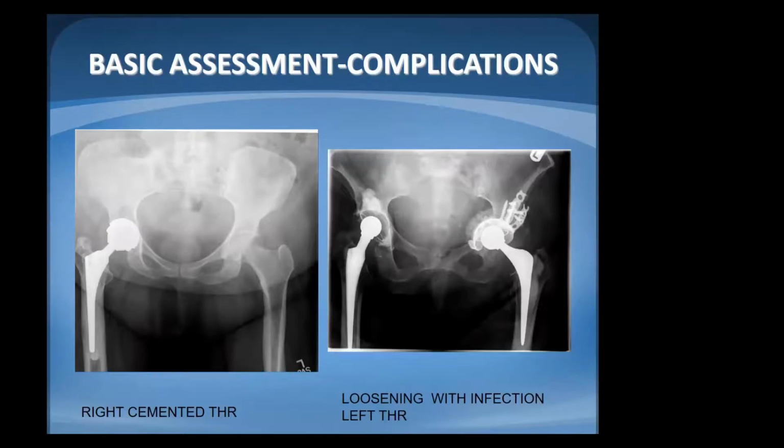That is a more threatening complication of the prosthesis, and what I would like to show you here is this kind of mushy appearance with osteolysis and loosening, extrusion of cement, protrusion of the acetabular component into the pelvis, and a clinical syndrome of pain and temperature.